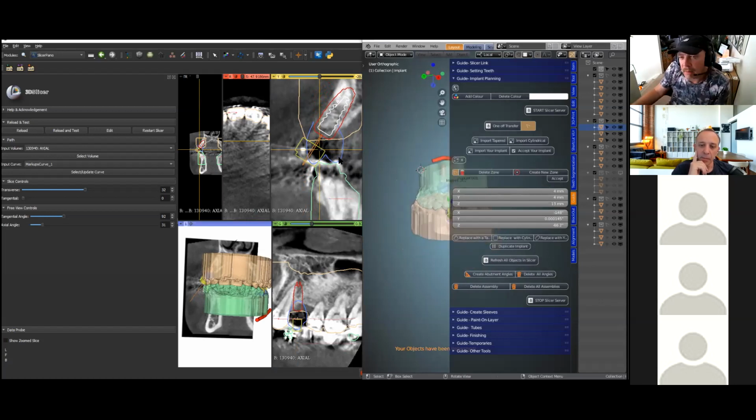Yeah. And I may decide, okay, this implant may be, and I'm not an expert in placing implants, so I'm not telling anyone how to do this. I'm the least experienced in that. I'll just do the software for this. So if I make mistakes, please forgive me there. So I'm going to put say a smaller implant there, maybe a 3.3, I think.